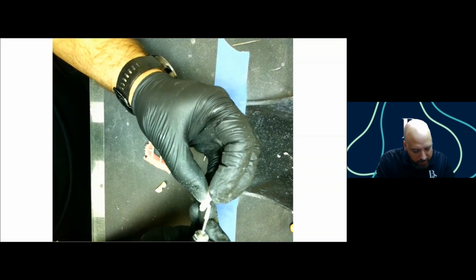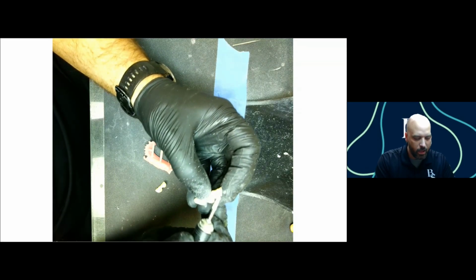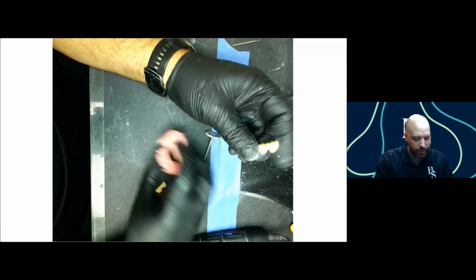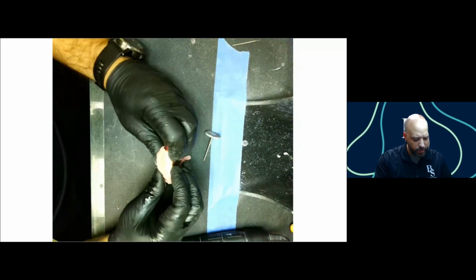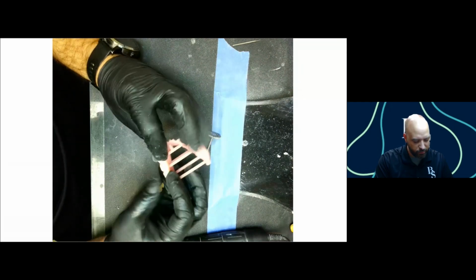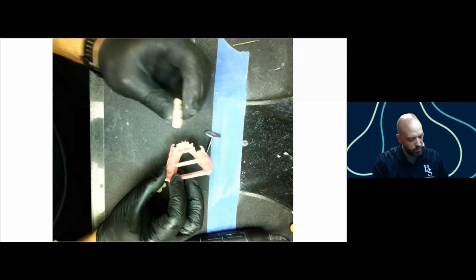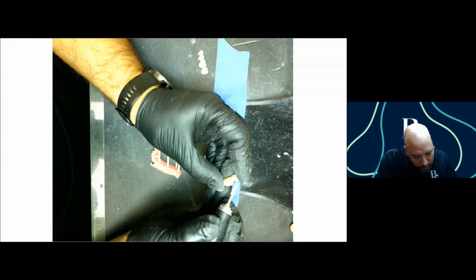There is a risk that you run of over contouring the underside. So always make sure that you're just careful with it. Once you think you've got it, that's when you want to start the test fit process. So you want to put it under here and then do the rock test. Make sure that it doesn't rock back and forth, which this one actually sits in here nice and solid. So I'm happy with this one. So we're going to move into the other tooth segment and get these nubs off.